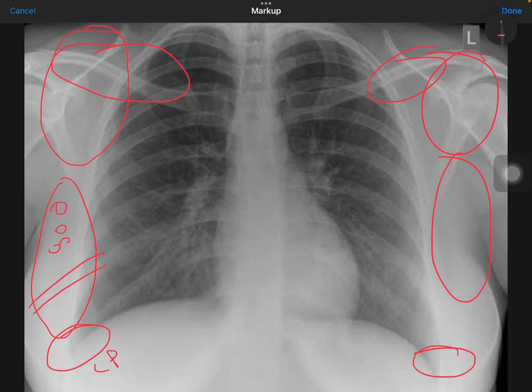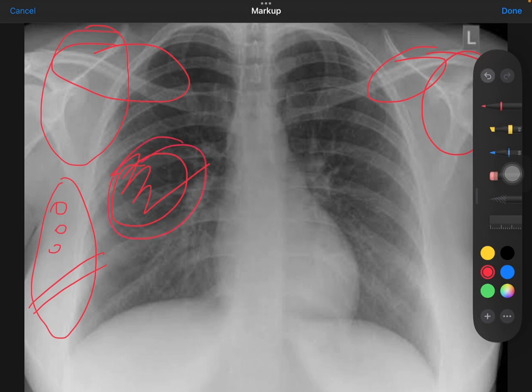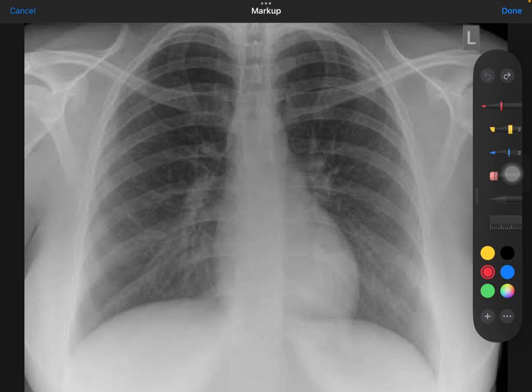Next, we go inside. We take a gross look at the ribs and the parenchyma, whether there is any fracture and what other abnormalities we see in the parenchyma. Usually when we get an X-ray, we directly jump to whether there is any opacity, consolidation, collapse or cavity, and we miss other relevant important structures. So to avoid this, start seeing the X-ray from outside to inwards. It will give more valuable information.